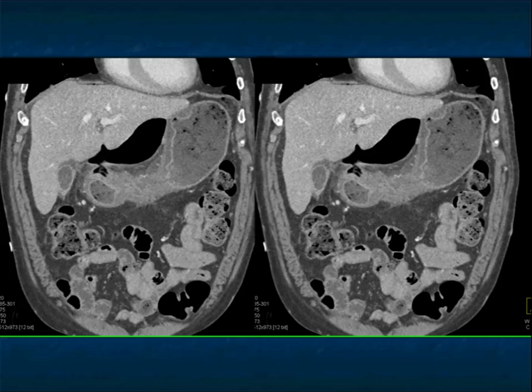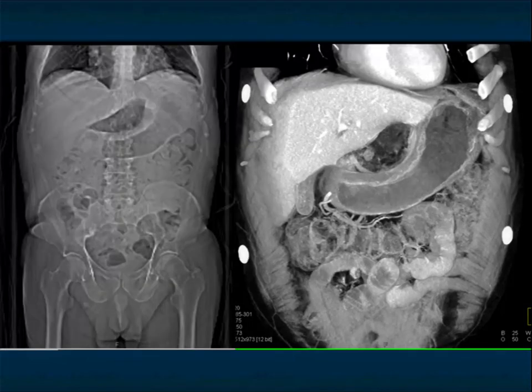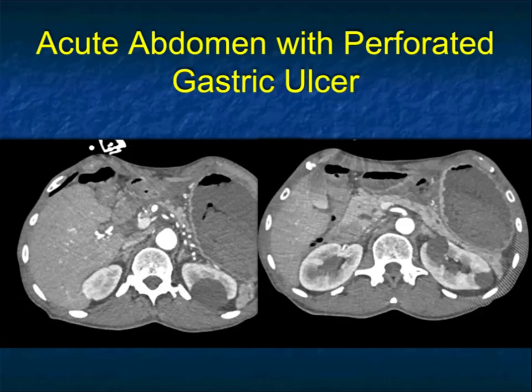Finding the ulcer can be somewhat challenging. Again, sometimes patients have multiple ulcers, and this patient did, but here you can see the tract between the stomach and the air in the region between stomach and liver. That's the focal perforation nicely shown. And again, here's another set of images. So in this case, you read the study, gastric perforation, ulceration, and highly suspicious malignancy. This patient will go to surgery for that gastric ulcer in most cases. Interestingly, on the topogram, which you can think about as a plain film, the space between that air and the stomach could be a great hint for pneumoperitoneum.